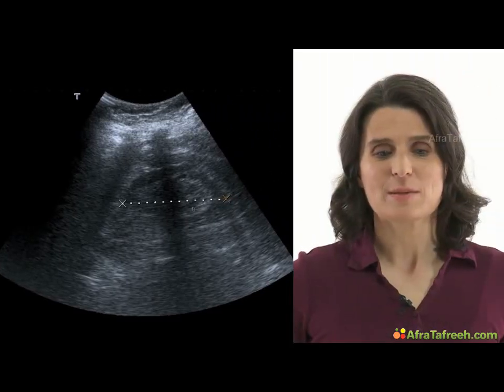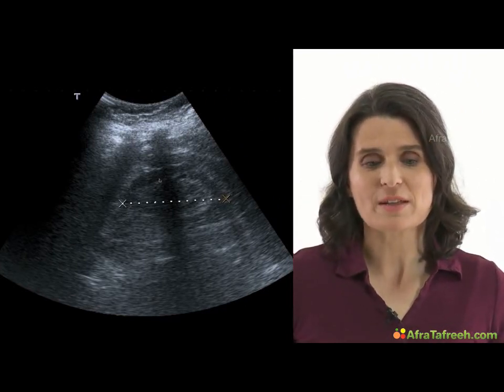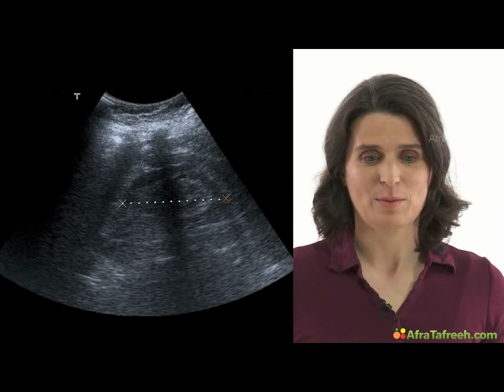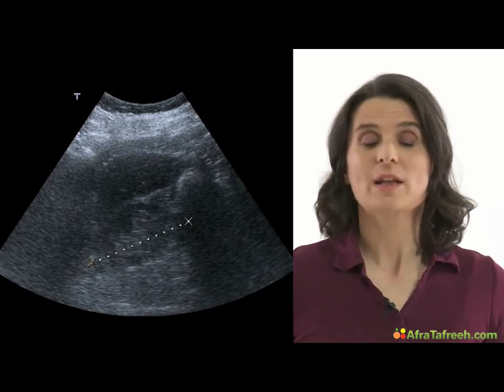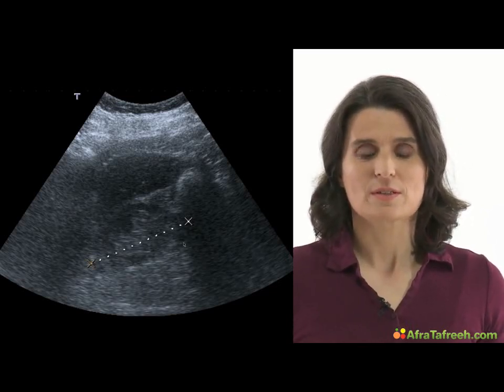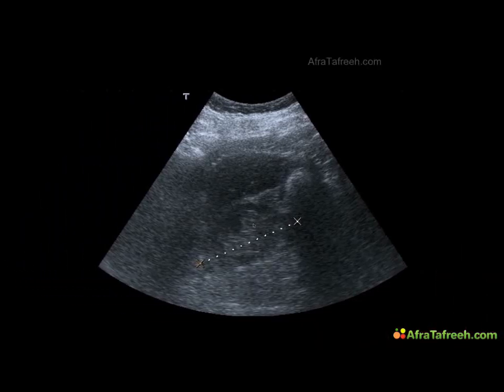It's easier here in this image because we've got the two marks, and in between we find this atrophic kidney, but you can see that the renal pelvis has a normal size, but the parenchyma is really very small. And also the borders are not easy to define anymore. This is an atrophic kidney. Same at the next image. You can imagine that it's not so easy to detect this kidney because it's got a reduced size, the hypoechoic parenchyma is very small, and we just see a little bit of parenchyma around the renal pelvis.